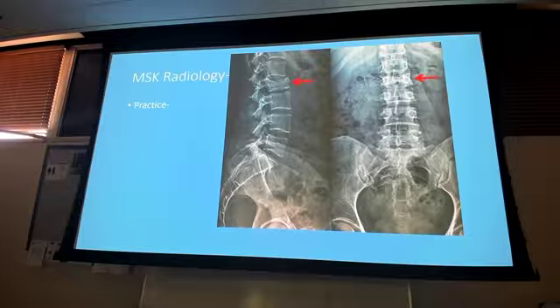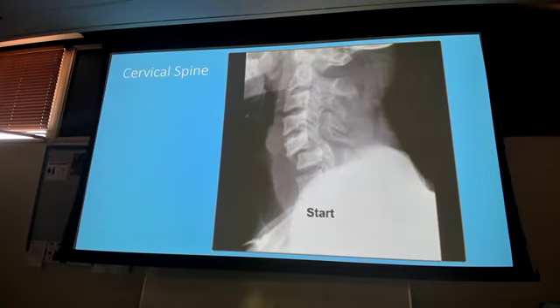I was gonna ask you, based on that, if it was osteoporosis. Yes, yeah. Hard to really see on the AP, right? And that's why I got that in there. It's the same patient. Really hard to make that out, and that's where that lateral really comes into play. But when you order a lumbar spine, you're gonna get both. You don't have to worry about ordering one or the other. Both are standard. Okay.